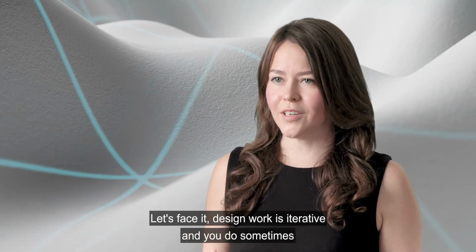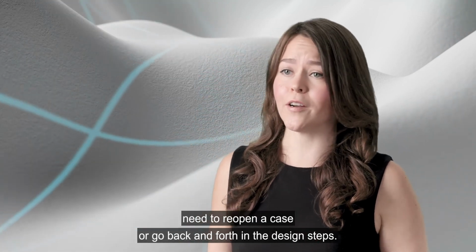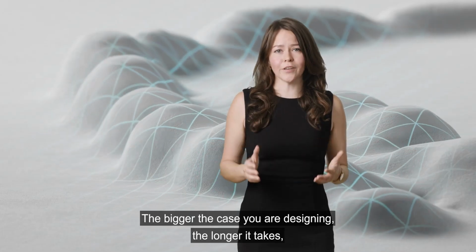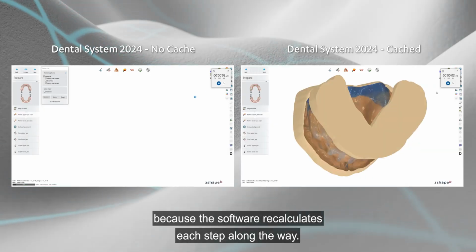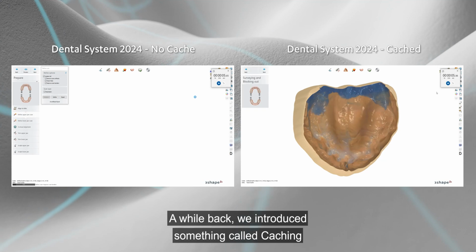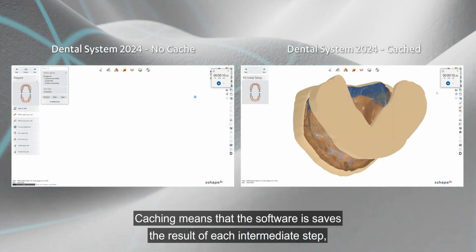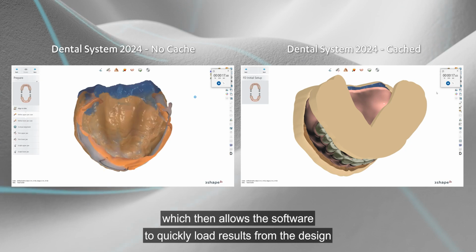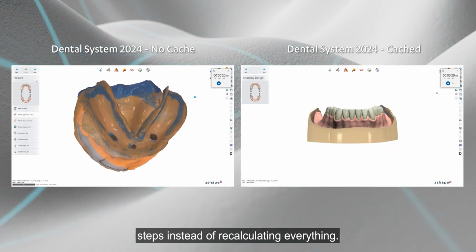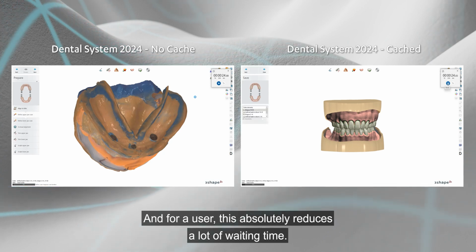Let's face it, design work is iterative and you do sometimes need to reopen a case or go back and forth in the design steps. And the bigger the case you are designing, the longer it takes because the software recalculates each step along the way. A while back, we introduced something called caching in some parts of Dental Designer. Caching means that the software saves the results of each intermediate step, which then allows the software to quickly load results from the design steps instead of recalculating everything. And for a user, this absolutely reduces a lot of waiting time.